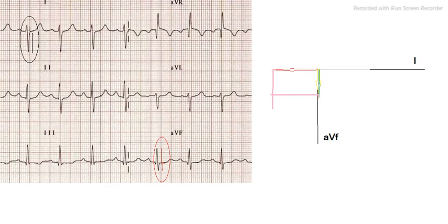So where are they meeting? They are meeting here. Now I draw a resultant vector from here to here. This is our resultant vector which signifies the axis. When you look at the angle made here, you see this angle is of course greater than 110 degrees. 110 degrees must be somewhere here. So it is greater than 110 degrees, which means it is deviating towards the right side. So this is the example of right axis deviation.